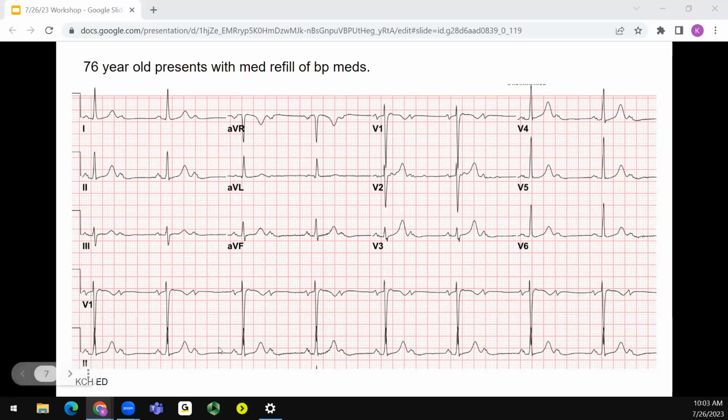All right. So that person saying they might be random. You can measure the PR for the one that's there. If it's the same every time, then you know it's linked. If it's random, then it's going to be different. You can use your calipers too. You should all have them. But actually, in MUSE there are calipers built in, and you can march out your P waves. Yeah, you just need a piece of paper.